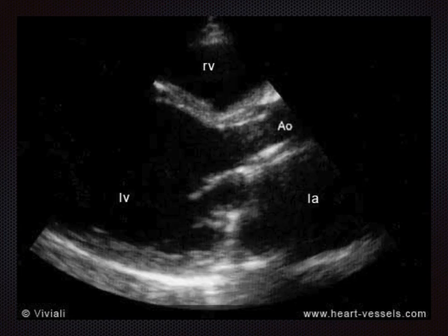In this next slide, we can see that the left atrium, even though we've got no reference points with markers, we can see in relation to the other aspects that the left atrium and the left ventricle look huge, and this is somebody who had dilated cardiomyopathy. So remember, the maximum diameter that we'd expect to the left atrium would be no more than 4 centimetres, and the maximum internal diameter at the end of diastole of the left ventricle should be really no more than 6 centimetres. So actually in this one, this is much more.